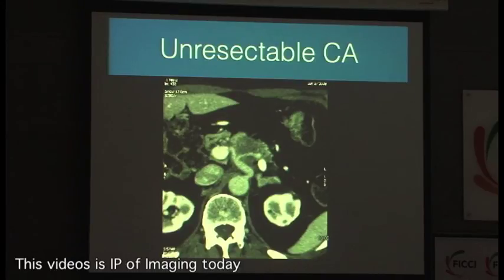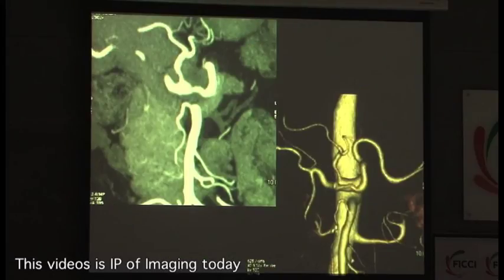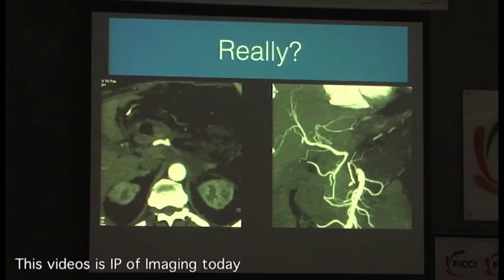Okay. Now this is a clearly unresectable carcinoma, according to NCCN criteria. There is no doubt about it. Celiac trunk, right, left, everything involved. Okay. You sure it's resectable? Unresectable, right? Okay. Everything is around it. Sure unresectable? Or somebody says it's resectable? No votes for resectable? Okay. So is it really unresectable?